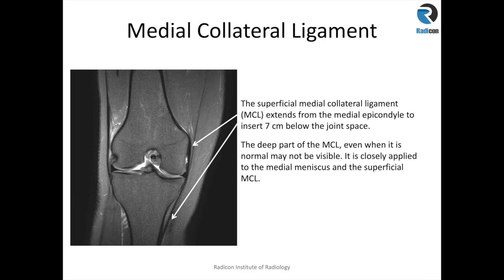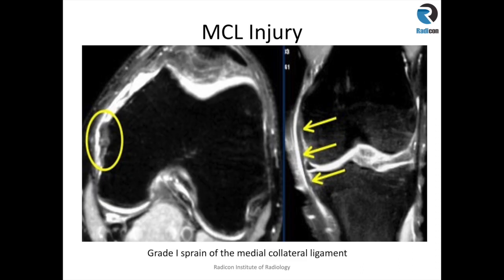There are superficial and deep parts, but you may not see those bands separately, and the deep part is closely applied to the medial meniscus and superficial MCL. So there are different grades of MCL injury.